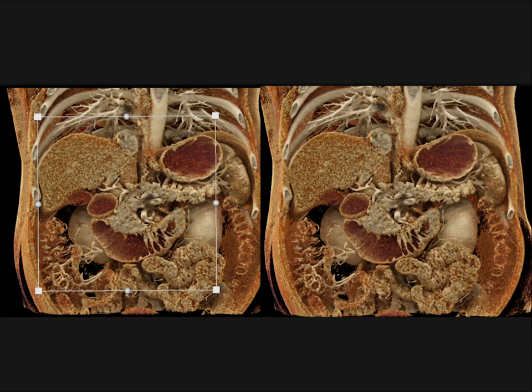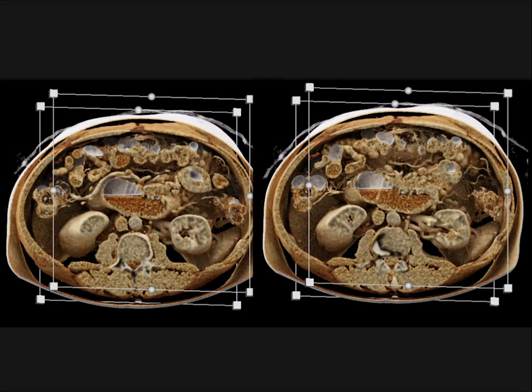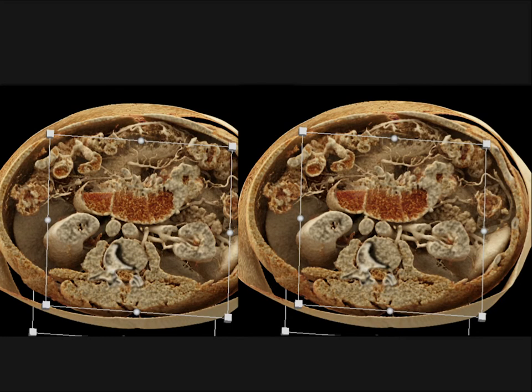Classic appearance. And you can see it very well when I do the cinematic, because now you see the fluid in the duodenum. You see the thickened folds. You see the infiltration by the ligament of Treitz. Here it is again with a view from above. And cinematic rendering is kind of interesting. In this case, I outlined the air within the bowel, the fluid, and where the fluid transition is, and that's where the patient's tumor is.